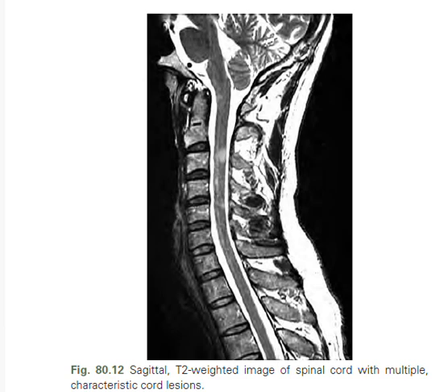Recognizing these characteristic short segment peripheral T2 hyperintensities allows you to secure an accurate diagnosis early and bypass the common diagnostic mimics, and confidently initiate disease modifying therapy before permanent axonal transection and irreversible disability sets in.